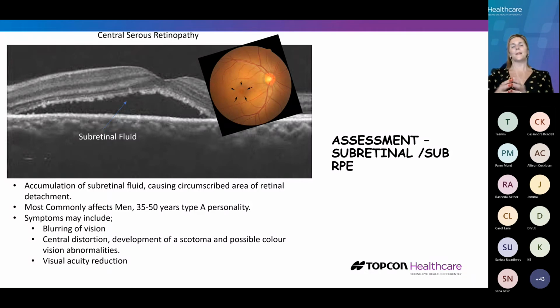Now, CSR can obviously be fairly simple. We know that we have many patients who come into us with CSR, but again, using OCT to understand and be able to visualize that and also educate the patient and move that patient on to where they need to go if necessary, but understanding that that CSR can sometimes become chronic CSR and become a bit more complex. So we're starting to see and visualize this section and understand what's happening for that patient. Typically on the fundus photo, we'd have seen it as a blister-like appearance. So again, that resembles then and pinpointing between the two.